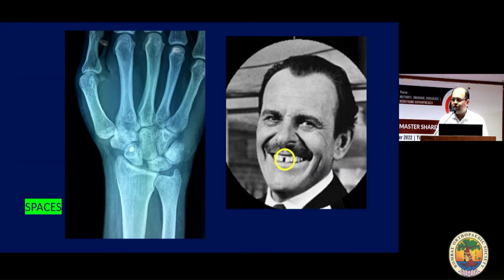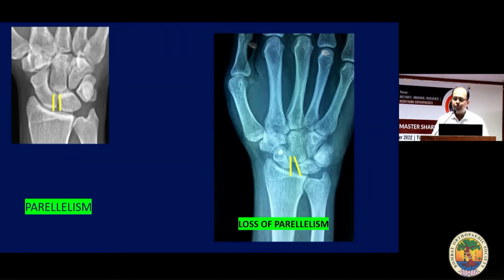Then there are spaces. In most perilunate dislocations, spaces are not that important, but yes, the Terry Thomas sign is a space between the scaphoid and lunate. Each carpal bone has an equal width of space, so we have to understand the space between two carpal bones. And the third important thing is parallelism. Usually it is seen in the scaphoid and lunate. If there is a loss of parallelism, then there is a possibility of injury to the carpus. So these are the three principles of Gilula that we should understand: arcs, spaces, and parallelism.